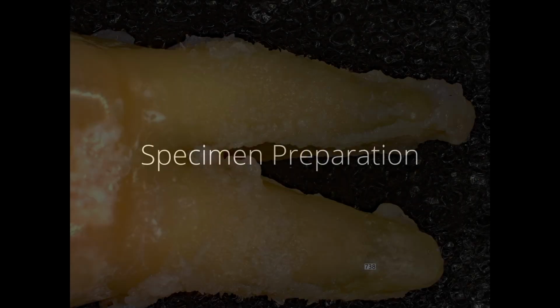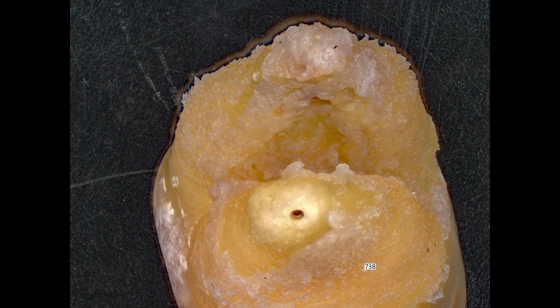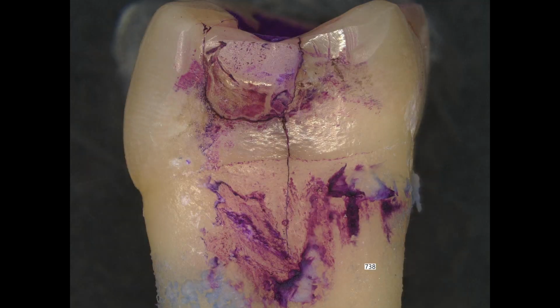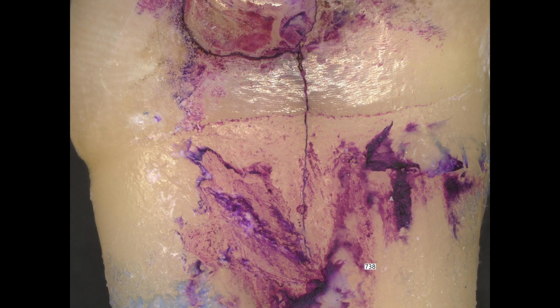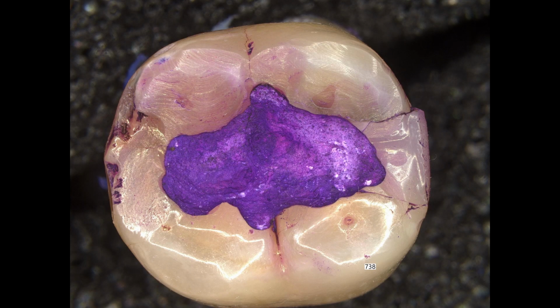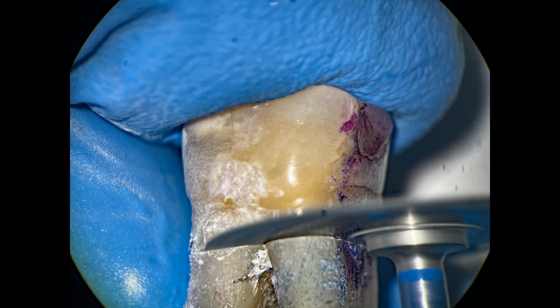I received the tooth from Dr. Cito in formalin, and we took some pictures of it. It looked to be intact. I did not see any obvious fractures. That's the business end of the root. There did not appear to be any areas around the apices. We did stain it and did detect kind of a fracture off of the composite restoration in the usual place that did not continue down the root. And occlusally, there weren't any real obvious fractures.